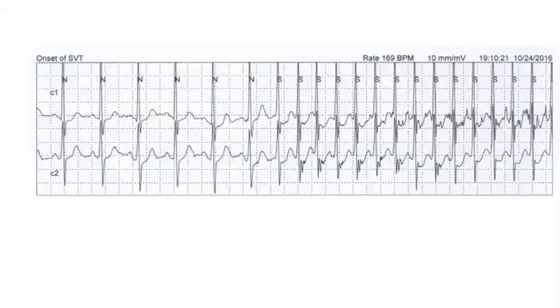A 20-year-old has a Holter, and on a Holter we find a lot of tachycardias. So this is sinus rhythm and this is tachycardia. So this tachycardia is what? Regular, narrow, complex tachycardia, and you see one P wave to one QRS. So this is a short RP tachycardia.